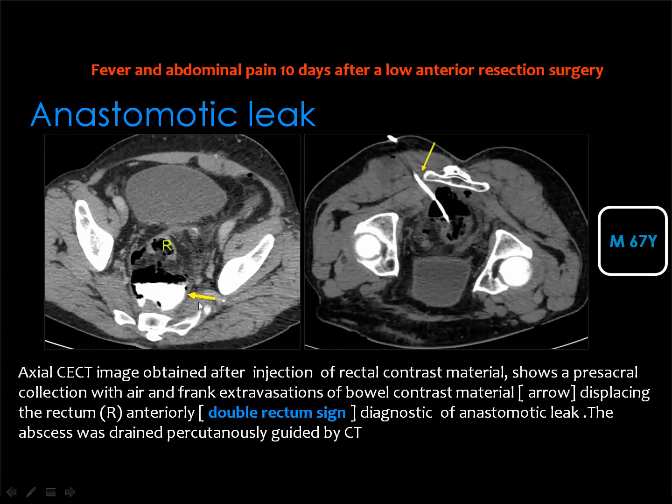Then this is another example, and you got air, contrast material and fluids in the retrorectal area. This is the rectum and this is the site of the leak.